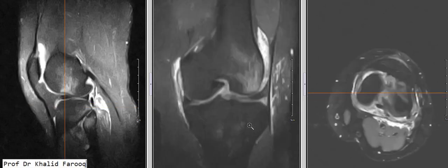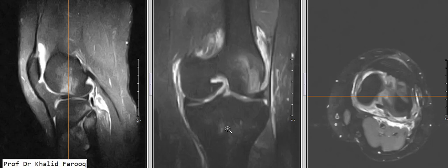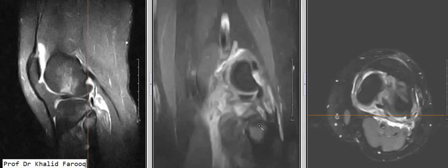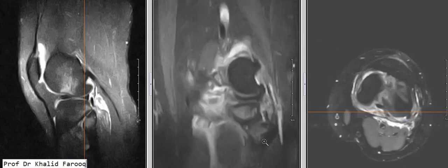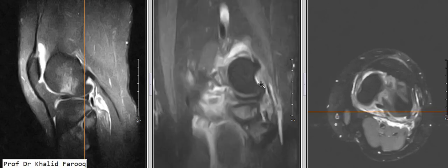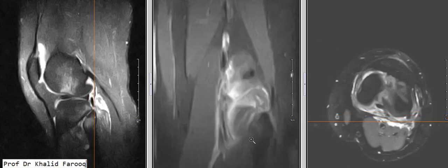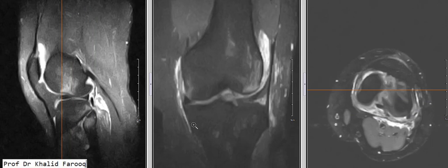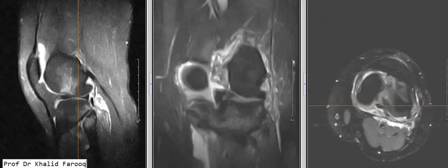Here we have abnormal signals in and surroundings of medial collateral ligament. Iliotibial tract is unremarkable, while we can see this is the head of fibula with bone bruising over here, and we can see fibular portion of lateral collateral complex, which shows increased signals in its surrounding and in its upper portion. Popliteus muscle is inflamed, so there is sprain of both medial and lateral collateral ligaments.